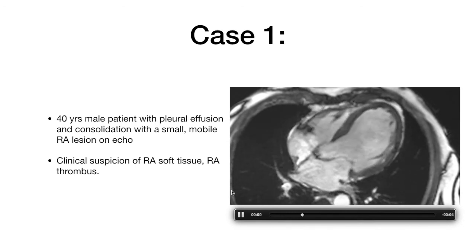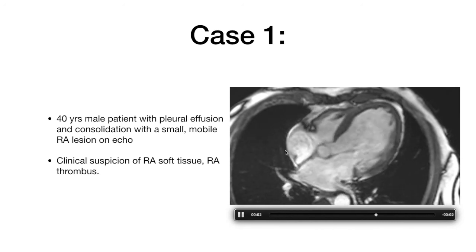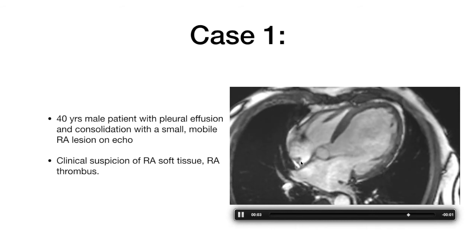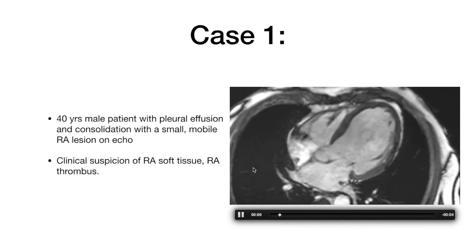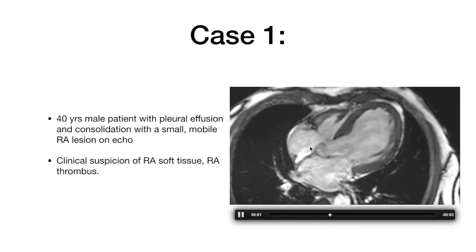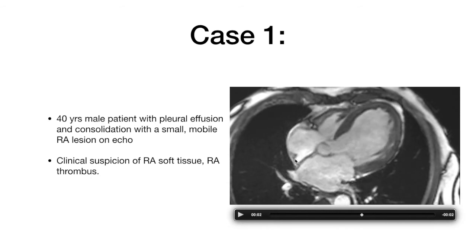Before reporting, we should understand importance of normal but prominent anatomical structures which may mimic a mass on echo. Crista terminalis, which is a crest between irregular right atrial appendage and an inflow sinus venosus part, if prominent, may be confused with a soft tissue lesion, but its anatomical location and signal intensity pattern similar to that of myocardium will help to differentiate it from a thrombus.